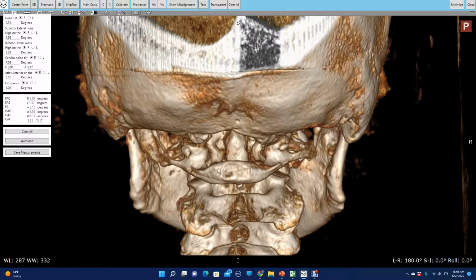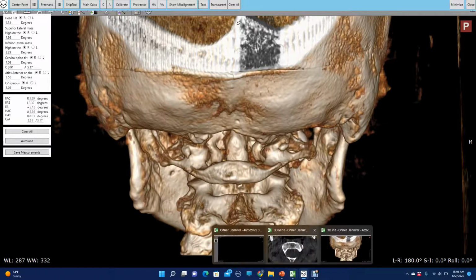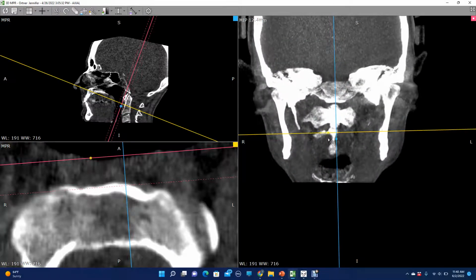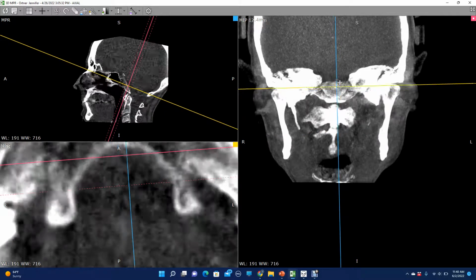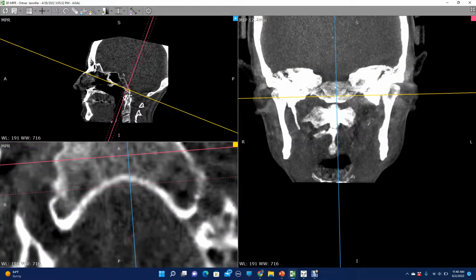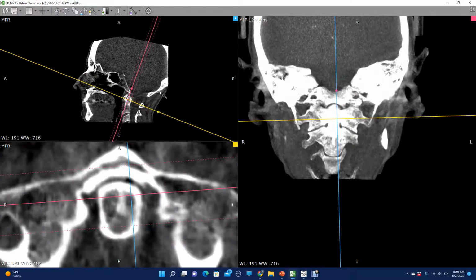And this is important because look here. See, it's shoved over to the right. And so it's higher on the condyles on the right. And this is my latest brain fart about this, is that if we look at our image, we have aligned this yellow axis to the floor of the occiput, and we're coming down to look at our atlas along the plane of the occiput.